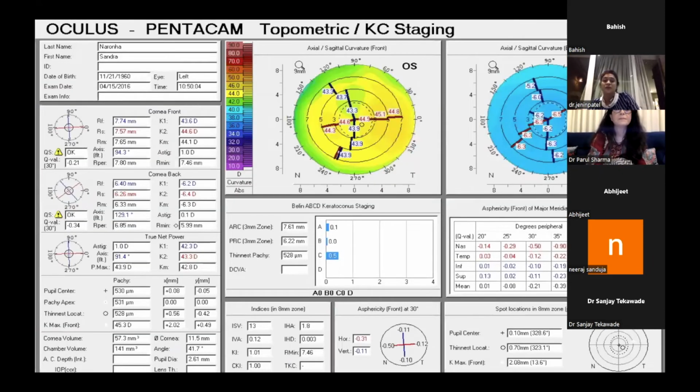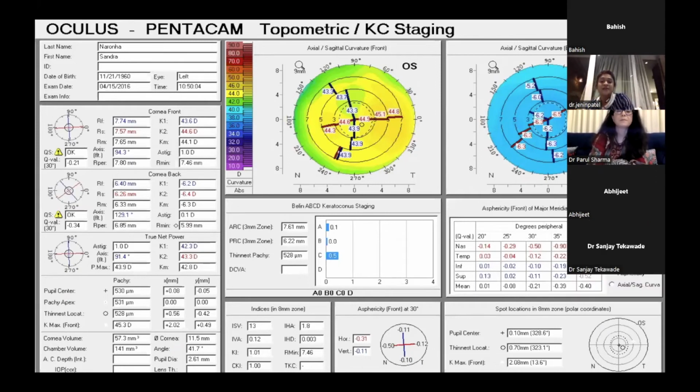And this is what we were talking about, where the parameters, so individual areas of the cornea, are broken up and the progression is analyzed. What it does is: A stands for the anterior surface, B stands for the posterior surface, C stands for the thickness, that is your thinnest point thickness, and D stands for the visual acuity. Depending on this, you put in the values. When we call the patient 3 months later, 6 months later, these values can be put in again, and this patient can now be looked at for progression, whether keratoconus changes are occurring or the patient is maintaining stability over the years.